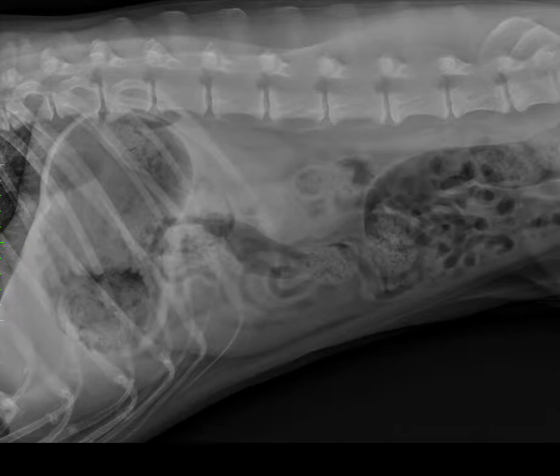Here we have a 9-year-old lab. The dog is showing acute onset of lip smacking and hard swallowing, and this has been presumed to be due to nausea. Once you've reviewed the radiographs using your systematic approach, then go ahead and watch this video.